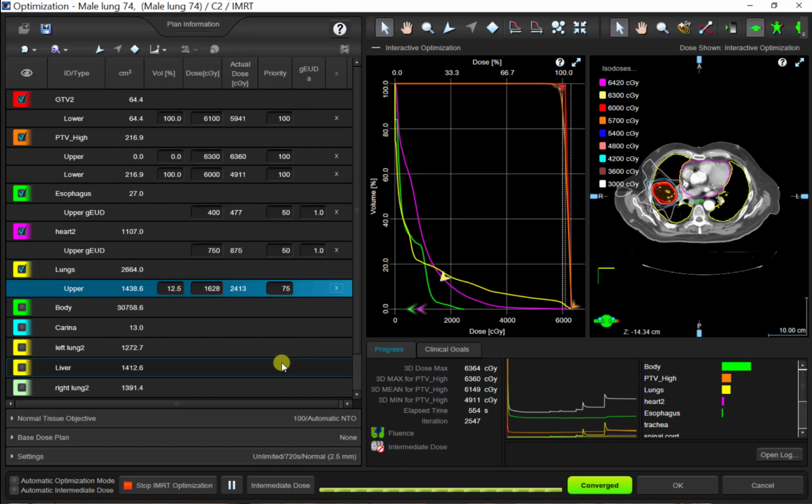one of the benefits of IMRT is that it's very, very fast. The optimizer is very, very fast. I've been talking a lot, but you can see how flat these lines are. It very quickly comes up with its solution. You can optimize these plans in just a few minutes. It's very, very fast. And that's why I uncheck these two boxes.